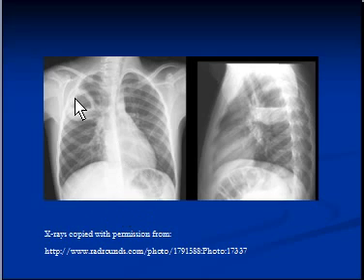A cavity appears on a chest X-ray as an opaque shadow, a circular opaque shadow with a lucent, radiolucent, meaning black shadow in it. This lesion is well defined, meaning it is clearly showing its boundaries. The cavity is also thick walled, and this is the thickness of the wall of the cavity here. The radiolucent, meaning black shadow, is produced by air which is trapped within the cavity.